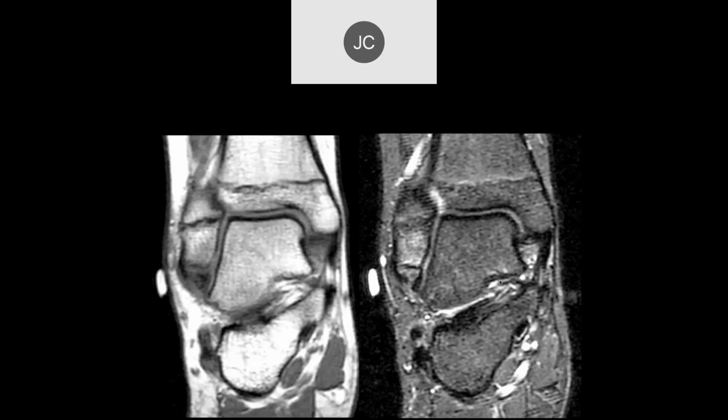Okay, Oleg. We have a skin marker here on both sides.